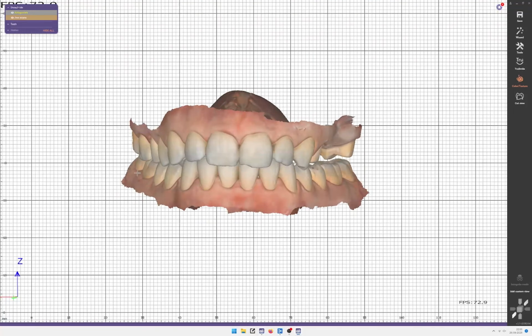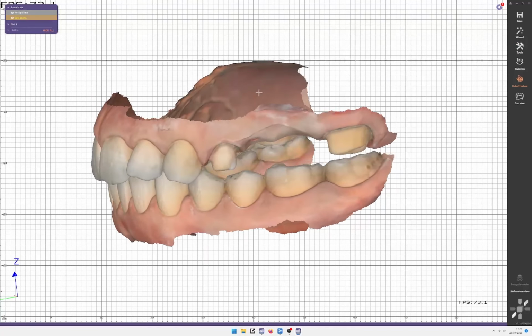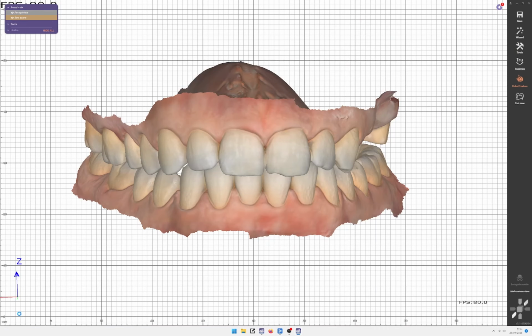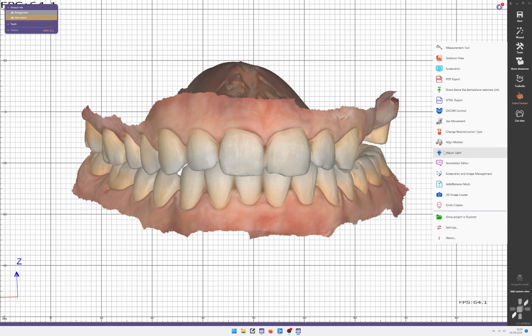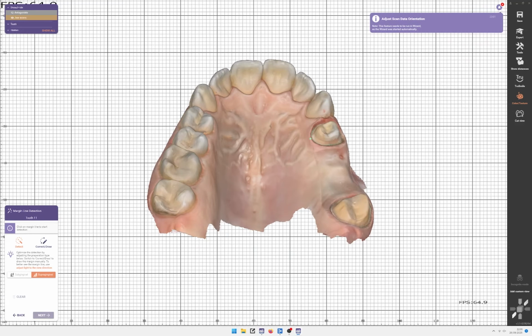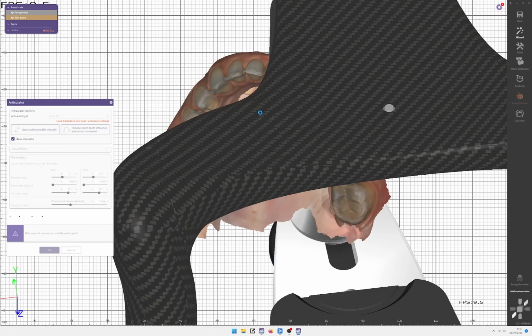So here everything actually even seems good. There's a bit of intersections. If we go to the articulator, wait, let me just say that this is a crown, for example. Okay, finished. So if we go to the articulator, you position it.